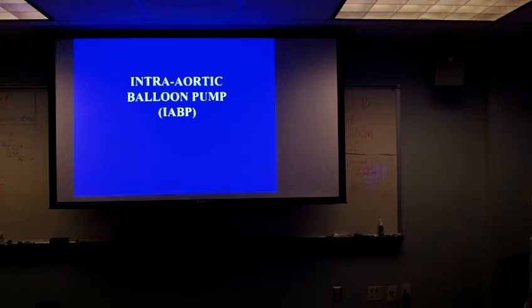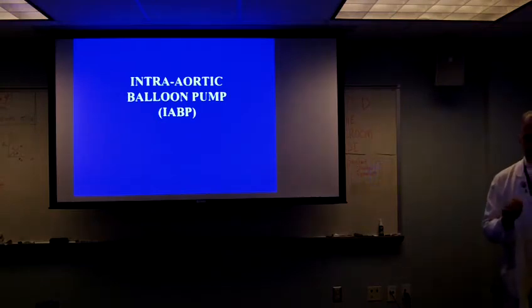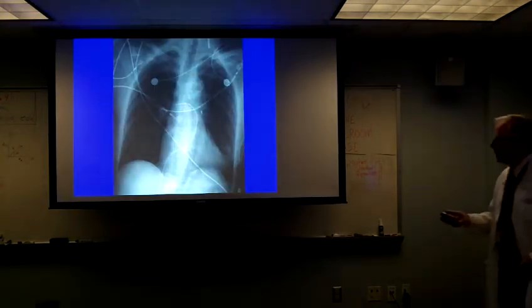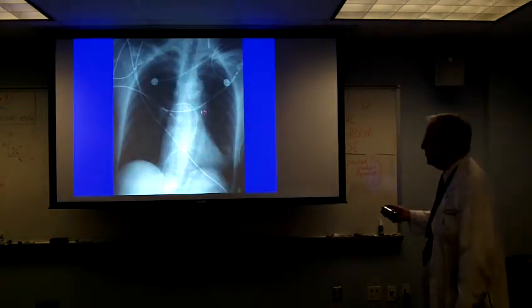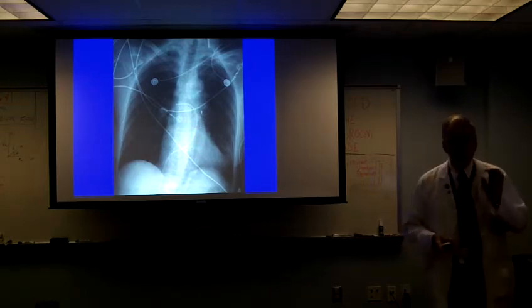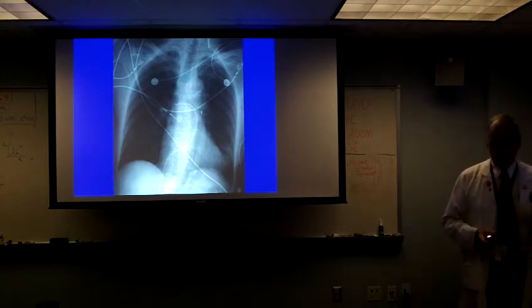The intra-aortic balloon pump. Anybody ever seen a radiograph and know that you were looking at an intra-aortic balloon pump? This is a new concept for all of you. All right, let me just take a minute to explain this. This is what it looks like. That's all you see if the balloon is deflated. Here it happens to be inflated at this point in time. But it's only inflated for a brief period.